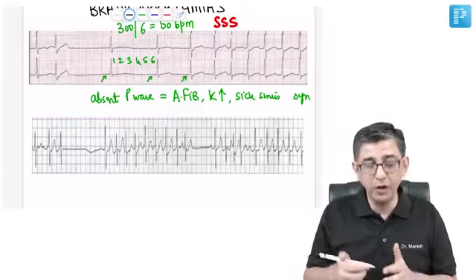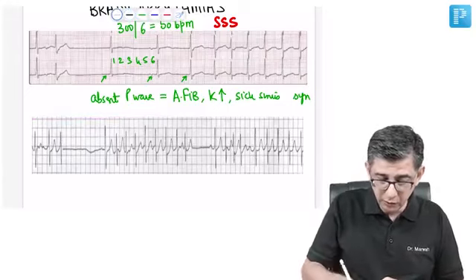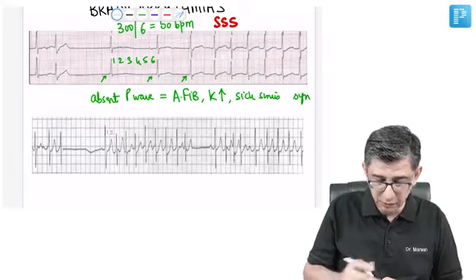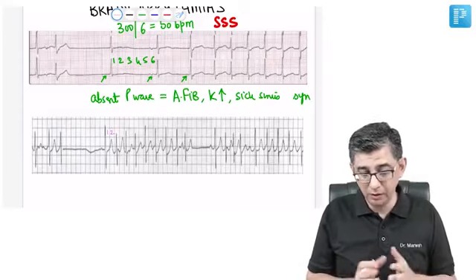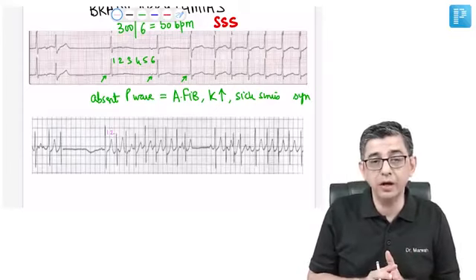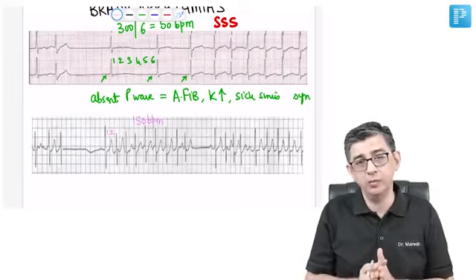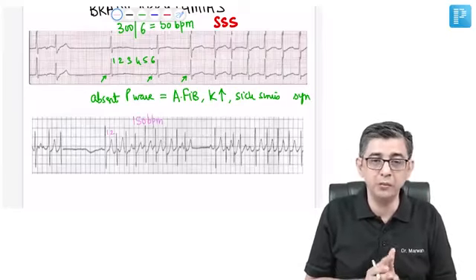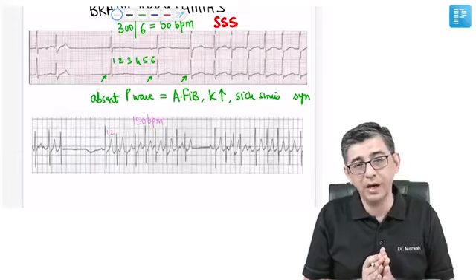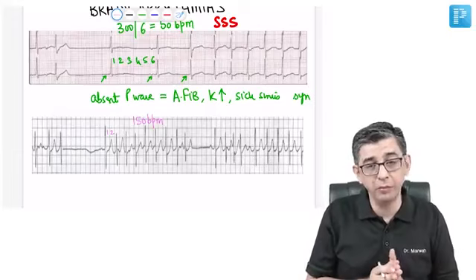First impression when you look at this would be that the RR interval of the patient is reduced. Most students, when they faced this MCQ, were totally zapped because the strip showed tachycardia at the moment, because I'm not sure whether it's a tachyarrhythmia or a bradyarrhythmia, but because the heart rate is fast, the initial impression was that this person was having a tachyarrhythmia, and it looked like even a PSVT to some people.